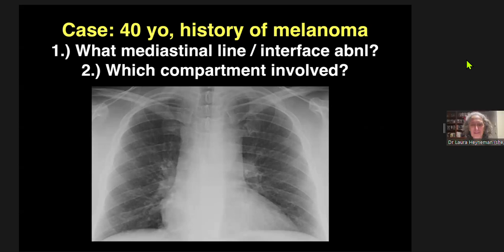Okay. So the question is how to differentiate a positive cervicothoracic sign due to thyroid extension versus opacities formed by the SVC shadow. Well, anytime the thyroid enlarges, it virtually always deviates the trachea, which the SVC will not do. So that's how I would answer your question, by looking at tracheal deviation.